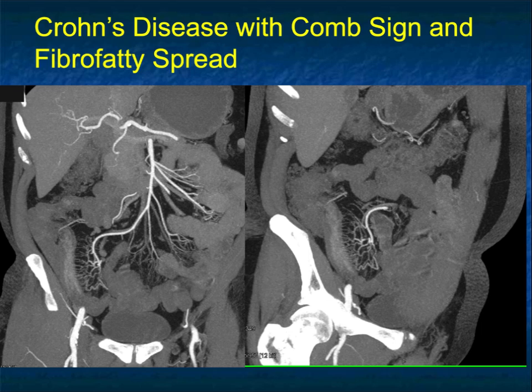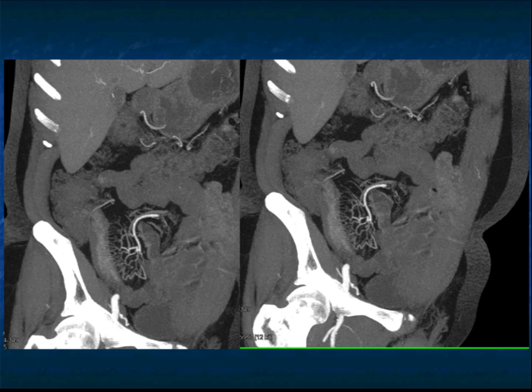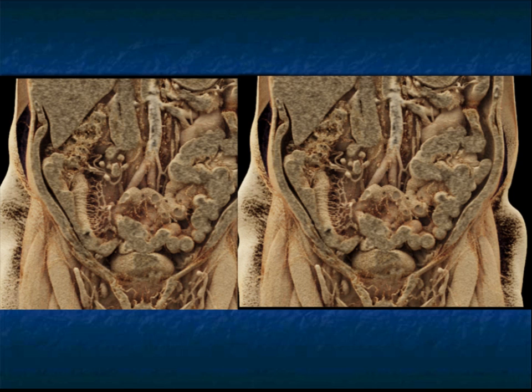Now, one thing with Crohn's, sometimes the question is active disease versus disease that's maybe not active. Well, fibrofatty proliferation can be seen in chronic disease or acute disease. The vasa recta prominence is typically associated with active disease, and the prominent mucosal enhancement is associated with active disease. You can see wall thickening as a chronic change, but when you see that submucosal enhancement, you typically are dealing with active disease. And here's just a few more images very nicely showing you all of those findings, particularly well defined on this patient's MIP imaging.